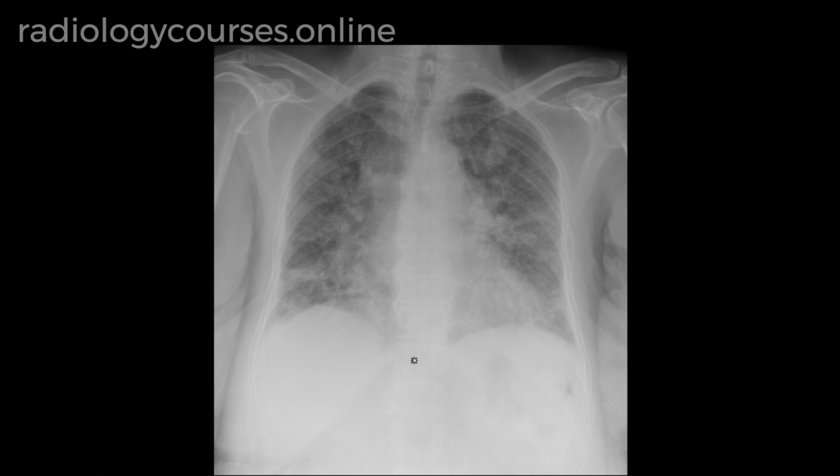The superior mediastinum appears prominent, but the findings are quite non-specific to comment on true mediastinal widening. Apart from moderate degenerative changes in the right acromioclavicular joint, the bones and soft tissues appear normal. So these are the radiographic findings. Based on this, I would proceed with my inference.